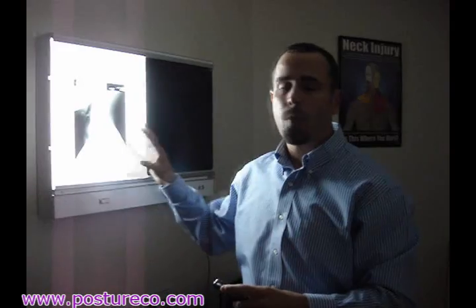Now the next step is, I'm going to go ahead and download these images to a folder on my desktop computer, where once I start PostureRay up, I'm going to browse to that X-ray image. So I can find the patient file and the X-ray image that I'm about to digitize. That's as simple as it is. Now if you have a digital X-ray system, direct digital or the CR technology, you don't even have to worry about this step. This is the most time-consuming part of using PostureRay, obtaining the images, and I suggest you have your staff members do this step for you. Thank you.